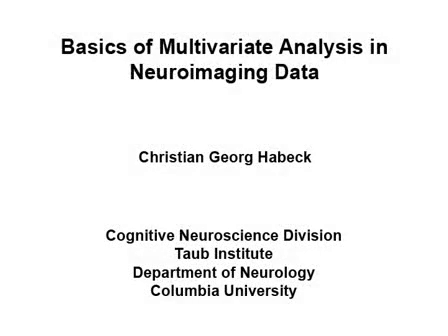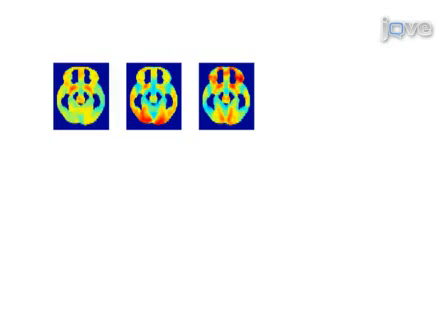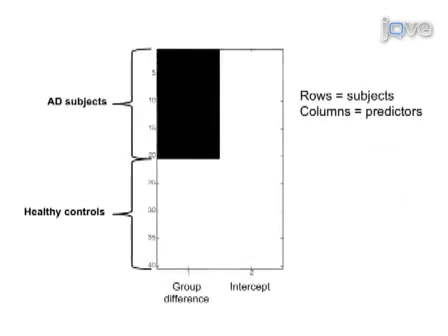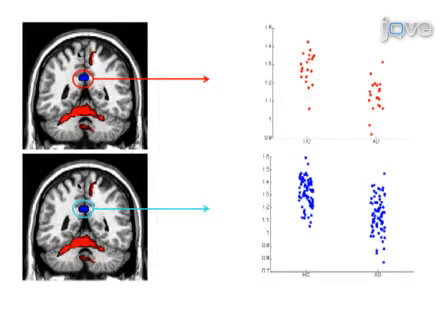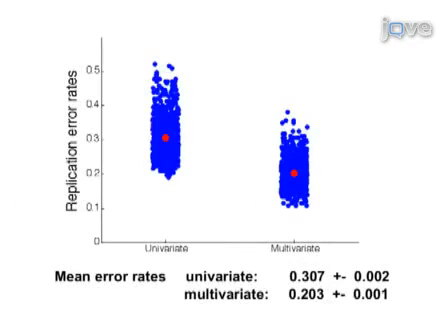This video demonstrates and compares multivariate and univariate analysis techniques for neuroimaging data with applications to Alzheimer's diagnosis. First, brain activity from 20 early Alzheimer's patients and 20 age-matched healthy controls is contrasted. For the univariate analysis, SPM is used to identify the brain region that shows the largest relative deficit in FDG PET signal in the Alzheimer's patients relative to control subjects. For the multivariate analysis, principal components analysis with linear discriminant analysis is used to derive the marker. Results indicate that the multivariate marker provides better diagnostic performance than the univariate marker and gives superior generalization to independent data.